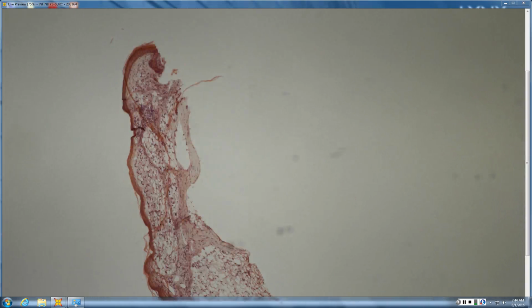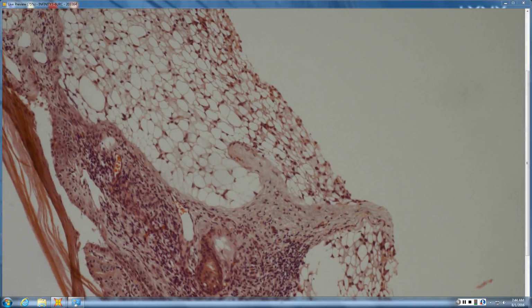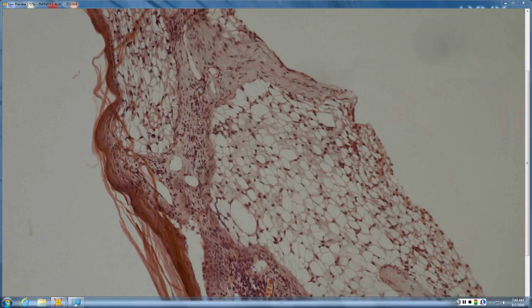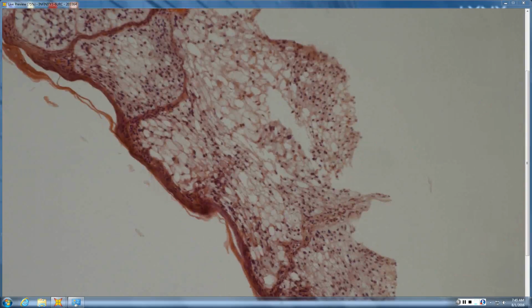Shave biopsy, there's some degeneration or a lot of papillary edema or fat way up high. Some clear cell change. So maybe that's not fat, maybe that's clear cell change. So clear cell Bowen's. Yeah.